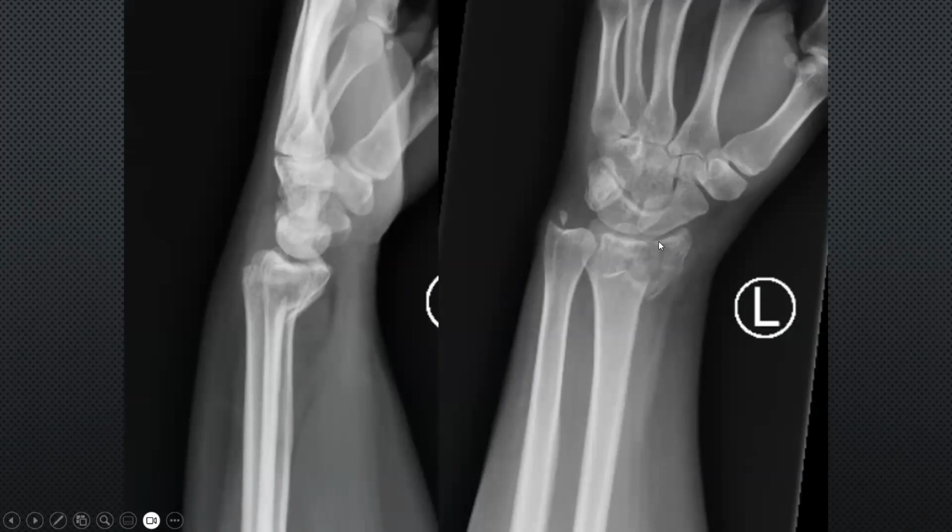So what is the diagnosis? Barton. Is it volar Barton or reverse Barton, I mean dorsal Barton? It's normal Barton. So the hand is dorsal or volar? Can you imagine the midline here in the radius? So the hand is in front of or behind the midline?